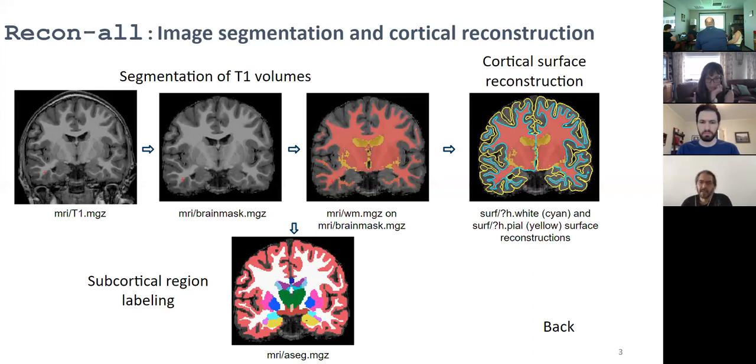Right, and there is no advantage or disadvantage to using the normalized structural rather than the raw structural in these cases, right, for feeding that to FreeSurfer? Well, there is a recommendation in that end. It actually does a normalization process as part of the recon. This T1 here is already, I believe, I'm not sure, I don't remember if this T1 is tweaked a bit.